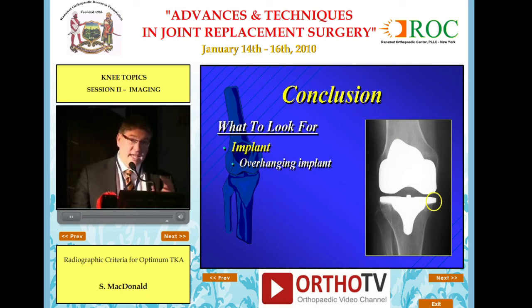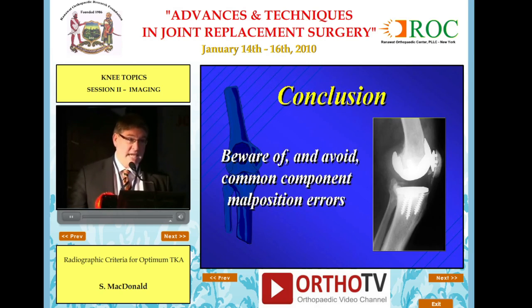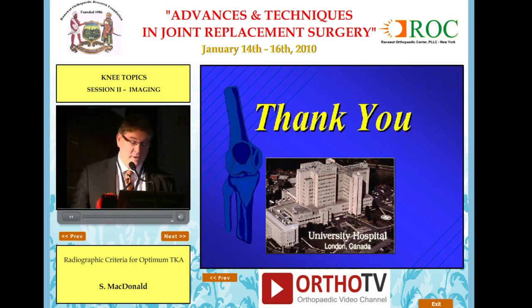And lastly, correlate each x-ray with the patient's pain. Things like an overhanging implant can create focal point tenderness that I've seen in patients, which can be addressed with a revision surgery if necessary, if non-operative treatment can't create that cure. So in conclusion, beware of and avoid common component malposition errors to maximize the results you get with your total knee replacement. Thank you.